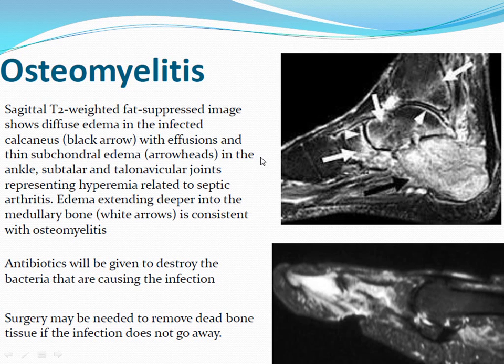So you'll definitely be doing a lot of studies for this. For osteomyelitis, you may sometimes be giving contrast. It helps you evaluate the extent of the infection and evaluate for any abscesses around. But certainly you can diagnose this. You can see the edema pretty well even without contrast.